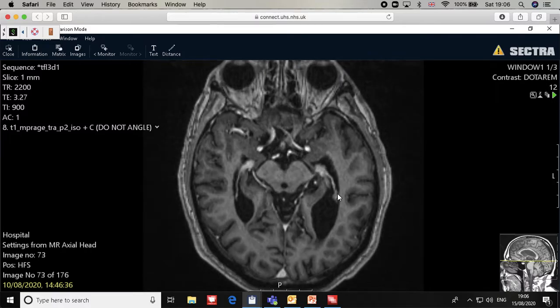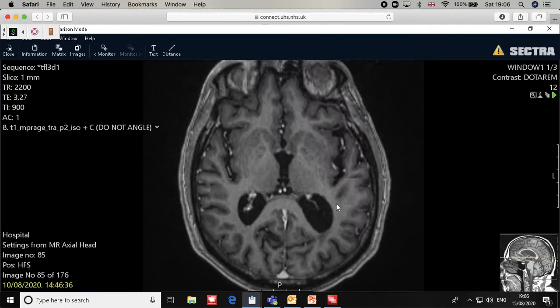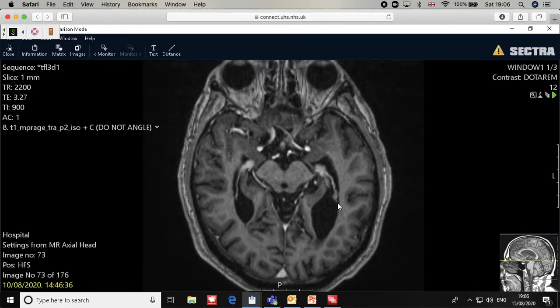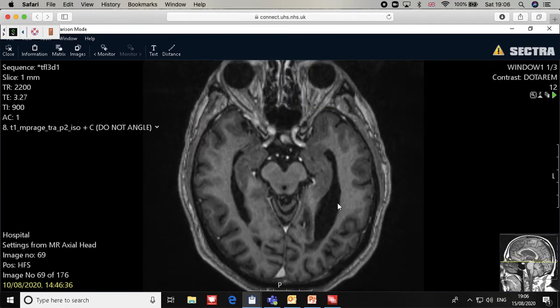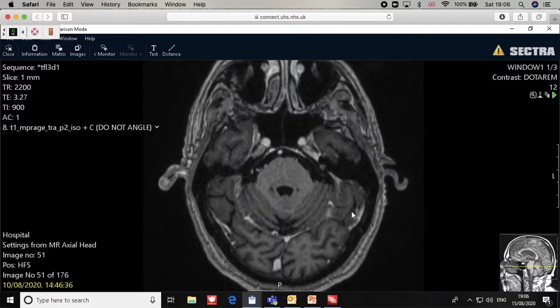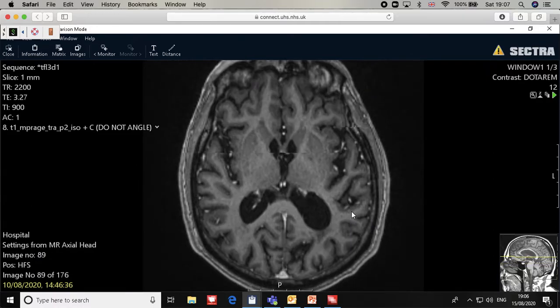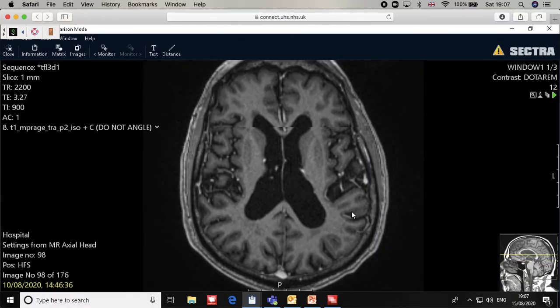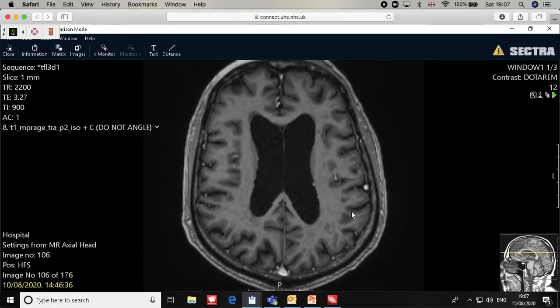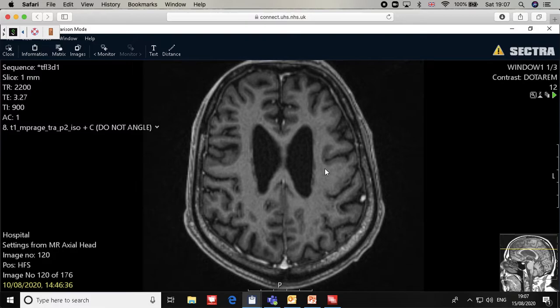So the hippocampus is very difficult to draw on the CT, so I didn't try to draw it in the CT because it's basically gray matter. You have to localize gray matter, so you cannot see the gray matter in the CT. Sorry, you have to do it in an MRI. So that's why you can practice on the MRI, and you have to put it in your planning system so that you can know how to do it.